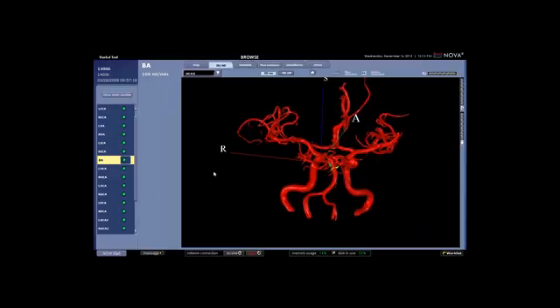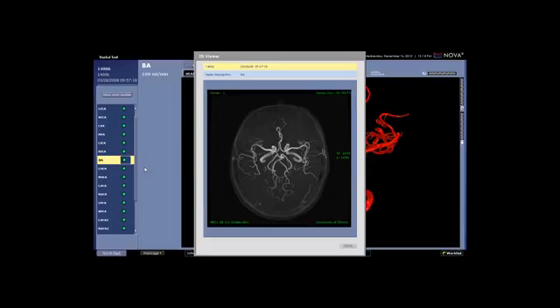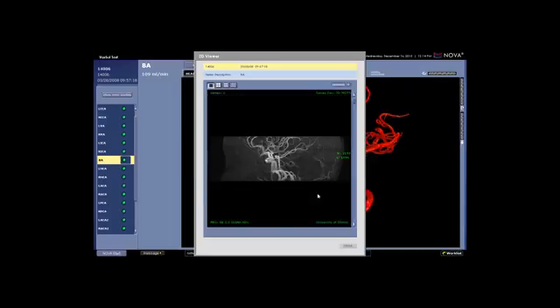I'd also like to show you the additional information that's available in browse mode here. So previously we were conducting the study. I showed you how the processing is completely automated. Now we're viewing a completed study, and all of those source images are still available to us. I can view the time of flight. We have a built-in 2D viewer. So this is available for quick reference.